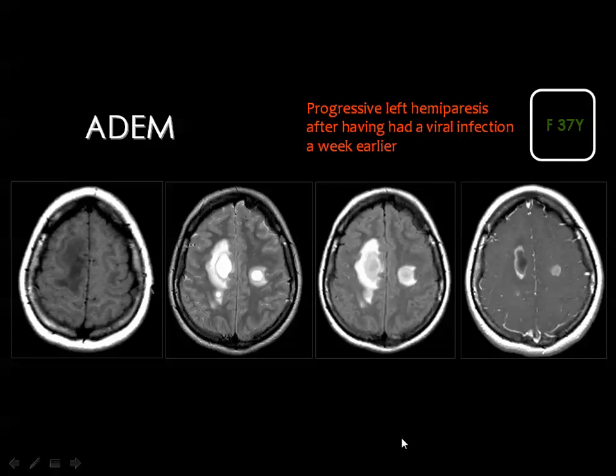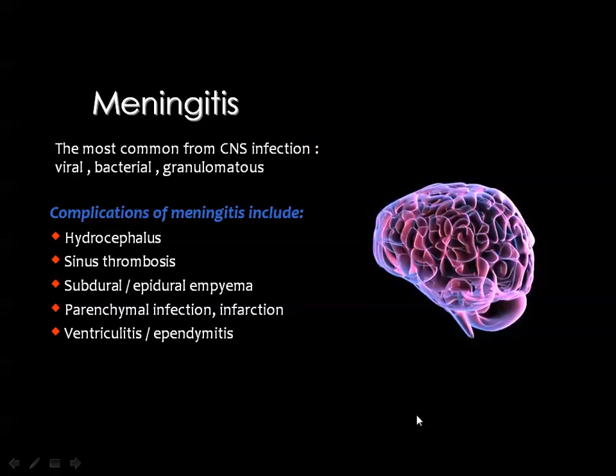And you can spot the diagnosis of ADEM by a typical history of the patient, which is a history of recent vaccination or a flu-like attack within 10 to 15 days before the attack of ADEM. And you see here, these are low signal lesions in the white matter, high signal in the T2, and high signal in the FLAIR. And sometimes you get enhancement in ADEM lesions.